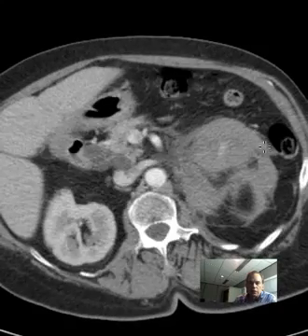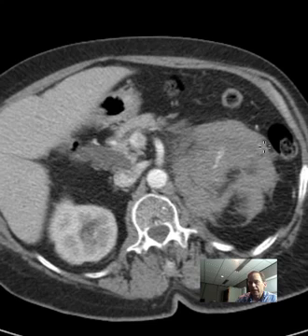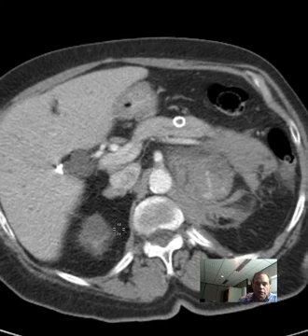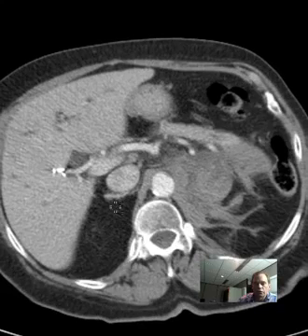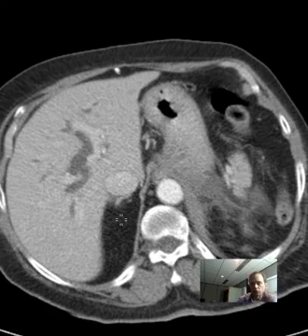So what would be superior to the kidney that might hemorrhage and still be in the perirenal space would be the adrenal gland. And let's look over on the right side. We have a little renal cyst there, and here is the right adrenal gland. Now normally there's not a whole lot to see, and that's why if you want to pick up an adrenal abnormality, you always have to look for it.